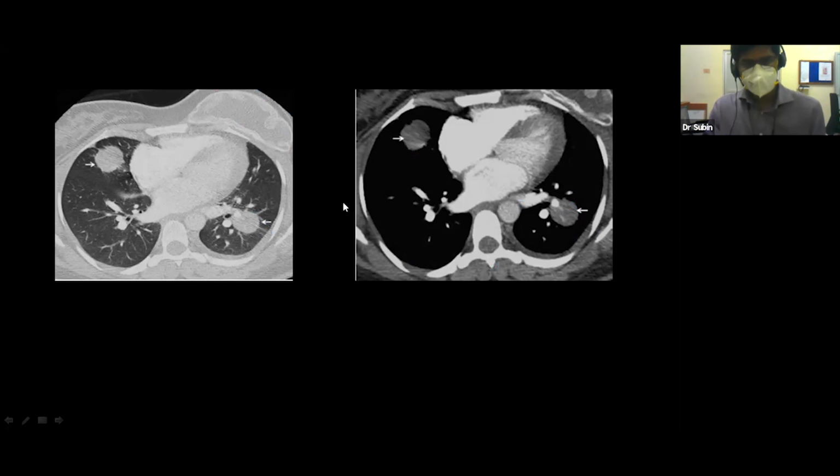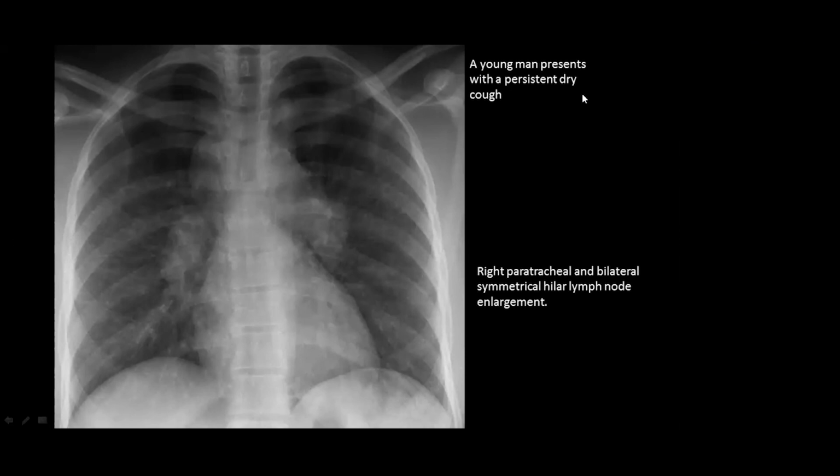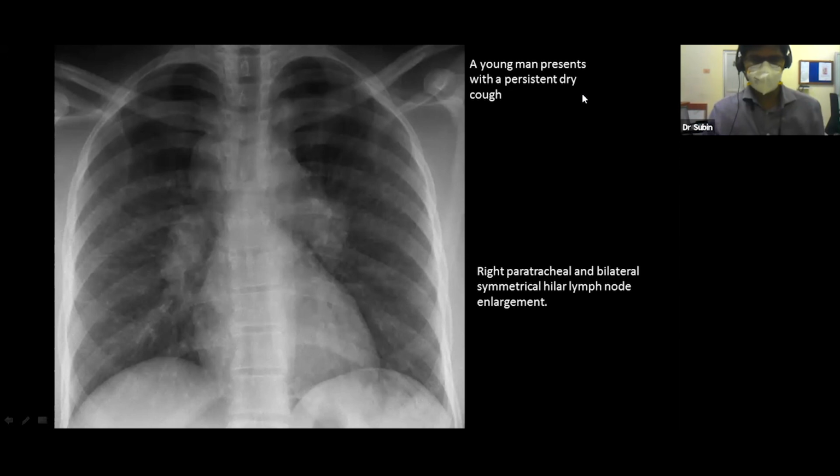When you see metastatic nodules, they'll be very well defined on CT also, just like how you see on X-ray. They'll look like proper cannonballs, of different sizes and shapes, scattered on both sides. Okay, this one again is quite simple, I think. This could be one of your spotter cases.